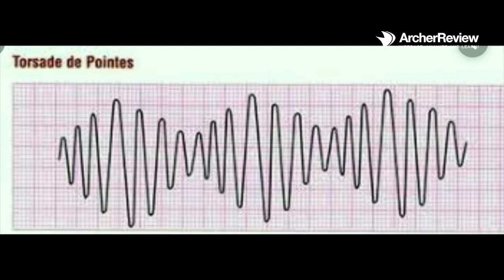This is considered a fatal rhythm if not broken, although some people can tolerate it for some period of time. It is a very serious complication that needs to be addressed quite quickly. So torsades de pointes, hypomagnesemia. Correlate those words for your NCLEX success, just like we talked about tall peaked T wave with hyperkalemia. Those are two really big ones to remember, but please go through this lecture a couple times, write down the major EKG changes, and you will be in good shape for those NCLEX questions.